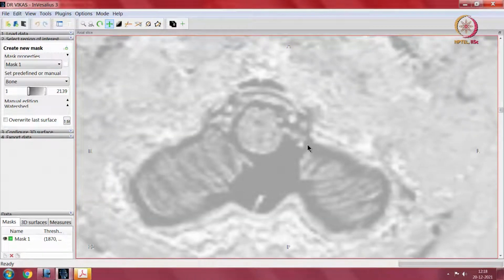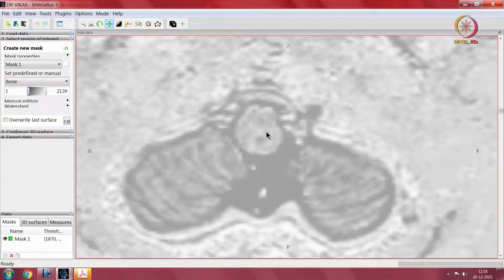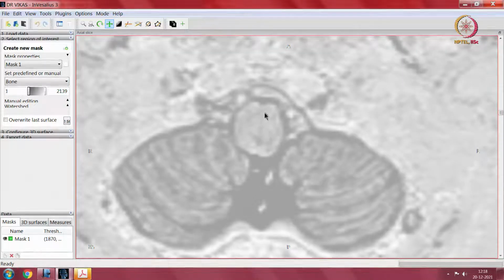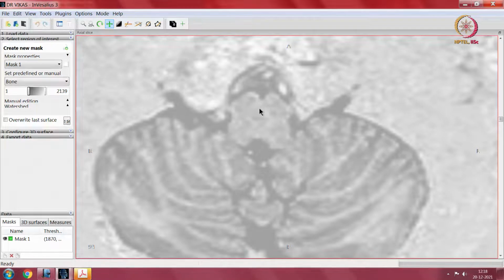In fact, the reason I am using this imaging is because it's been acquired using the best possible techniques for white gray differentiation. So, brainstem. Here, lower down, the spinal cord continues into the brainstem. If this is the brainstem, then what part of the brainstem? This would be the medulla, which continues down as the spinal cord. Anteriorly would be the midline small deflection which is the fissure. On either side, these bulges which are seen are the pyramids. Okay. So, these would be the pyramids again.